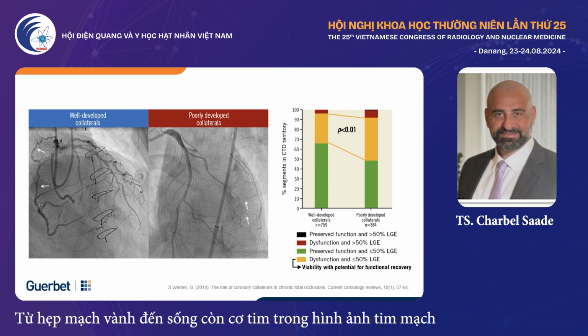Here, if you also have a look, we're looking at patients that have good collaterals versus poorly developed collateral vessels. Sometimes patients do have poor collateral vessels, and so that's why 8 to 12 minutes does not do you justice in cardiac MR. You need to actually wait at least 15 to 20 minutes in order to get really good imaging in case you don't have very well-developed collaterals.